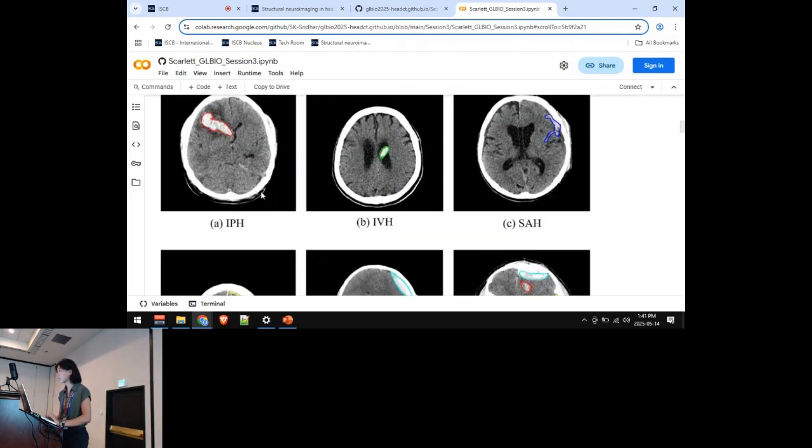Yeah, so basically the white pixel intensity is the same in these images, but you look at shapes to differentiate. So your question is why the intensity looks the same but not the shape?